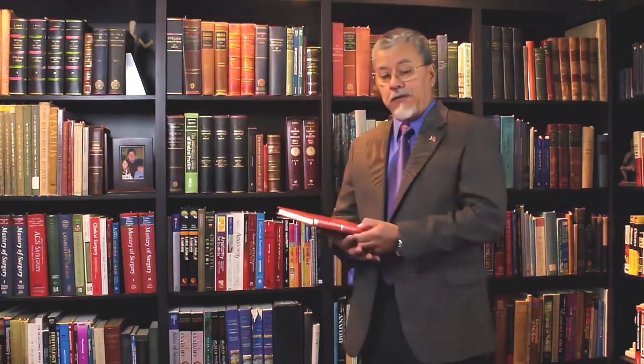Back home, Dr. Ravitch and his assistant, Dr. Felician Steichen, started doing research and development on a new stapler. You see, the Russian stapler was handmade, and the parts were not interchangeable between staplers. Dr. Ravitch and Dr. Steichen developed the instrument and approached American manufacturers, and they were rejected.